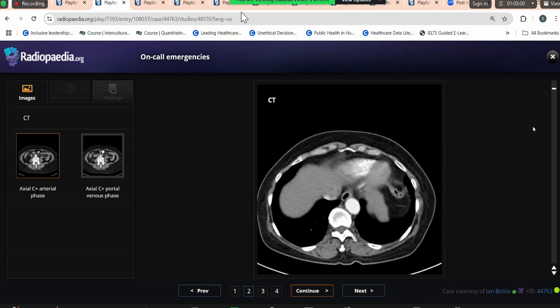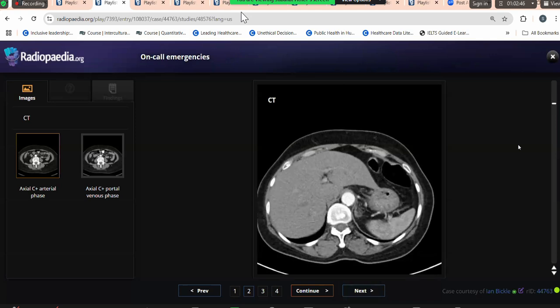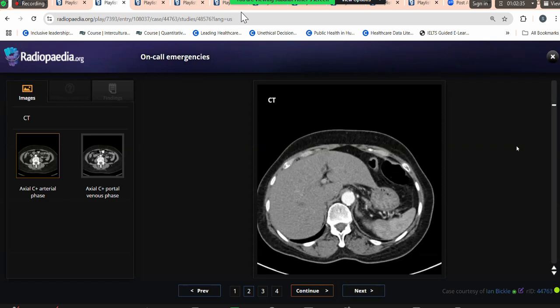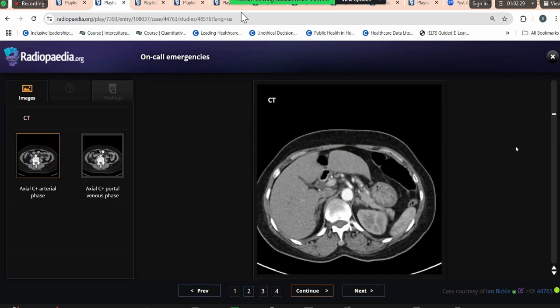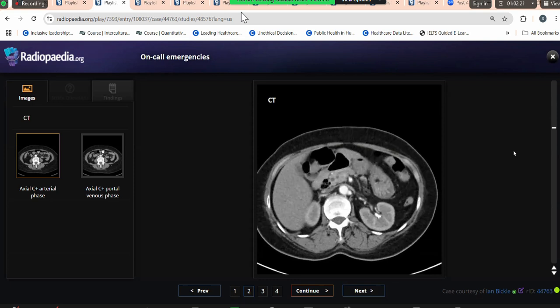So I've been presented with a CT scan of the abdomen of a female patient. I'm scrolling from top to the bottom. The first abnormality which caught my eye is a faint, ill-defined hypodensity in the liver parenchyma in segment 5. As I scroll down inferiorly, bilateral adrenals look normal to me. The spleen shows arciform enhancement in this arterial phase. The pancreatic tail, body, and head also look normal. I cannot appreciate any pathology within them.